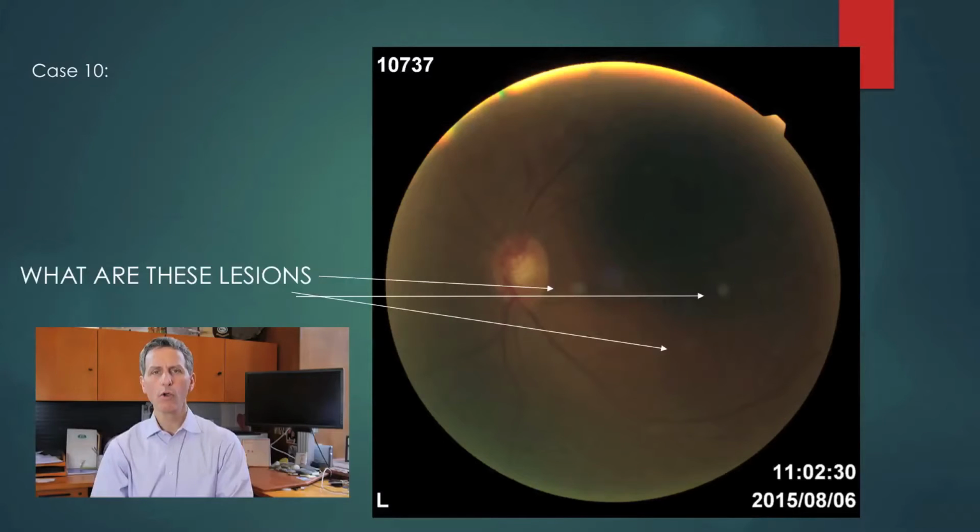This is a poor quality image. I cannot see the center of vision, the macula, or the fovea very well. I can see the optic nerve. What is being pointed at by the arrows are artifacts. These are light hitting the retina in a funny way because of the lens. These are not drusen or lipid.